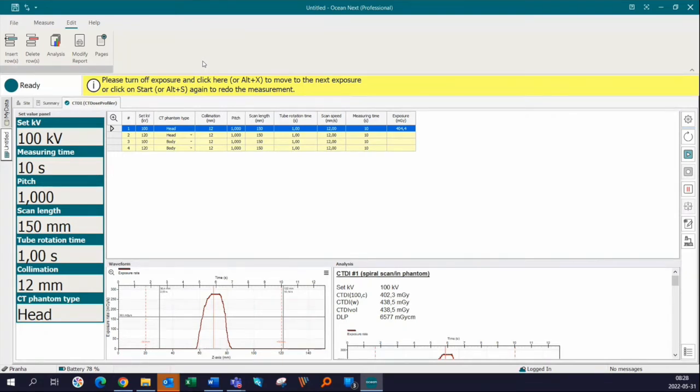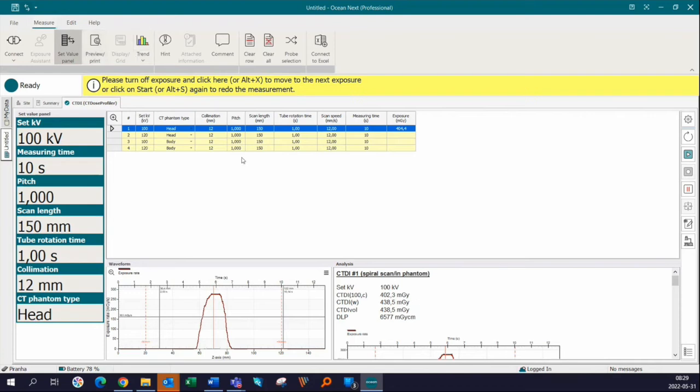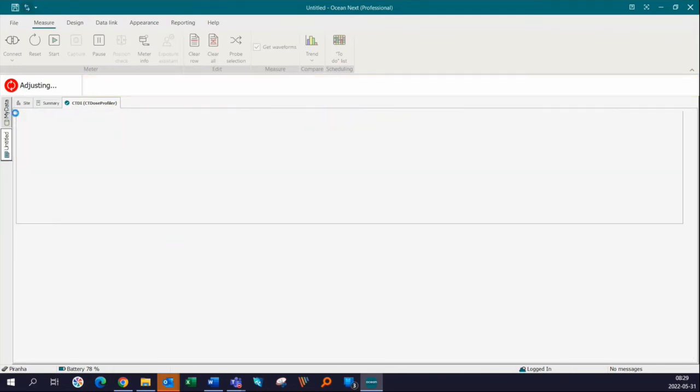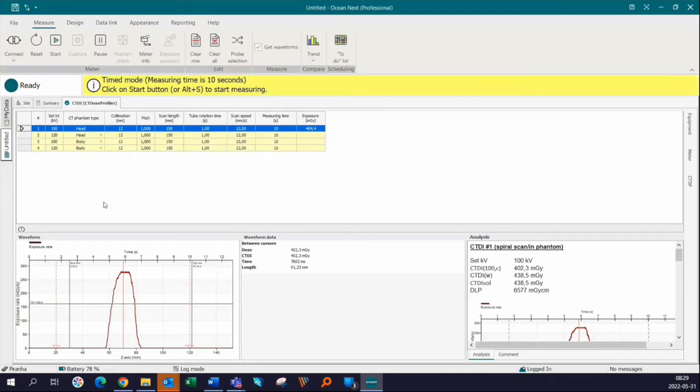different design options when measuring as well, because you can always toggle back to the old design view that is called the studio view by using this button here, and that will toggle to the old user interface. I can display that quickly, but then we no longer see the set value panel, and the template is viewed in the old view, and you have the old measurement controls and a lot more options.